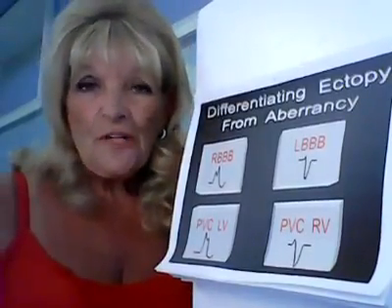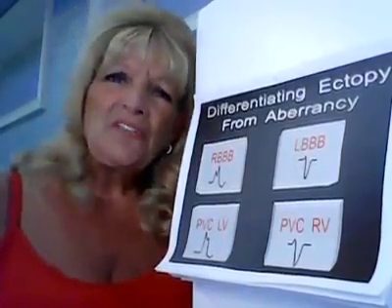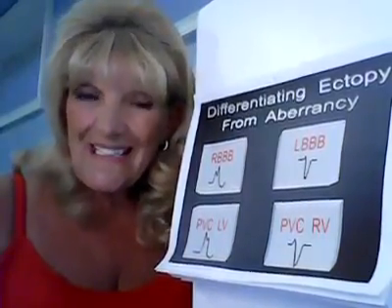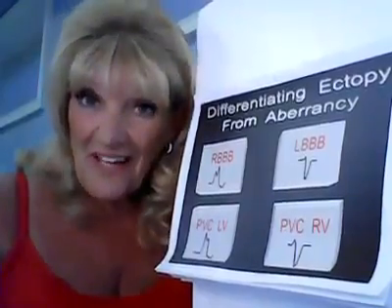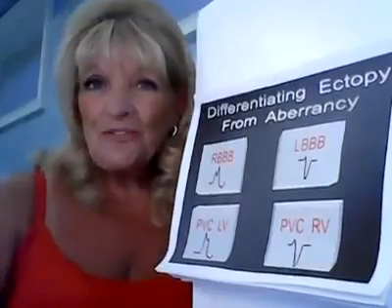So in order to differentiate Ectopy from Aberrancy, or in order to differentiate SVT with a block from VTAC, we have to know the configurations. And so that's what I'm going to teach you right now.